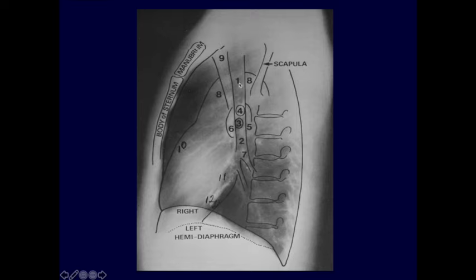Okay, so you're going to see a lucency down the middle, a density anteriorly, and a density posterior superiorly. You're going to have a relative paucity of densities in this inferior region here, and this is normal. If you have densities that are surrounding the entire bronchus here, that is often a sign of lymphadenopathy called the donut sign, so get used to this normal pattern at the hila. Lucency down the middle, density anterior to it, that's the right pulmonary artery, and density posterior superiorly.